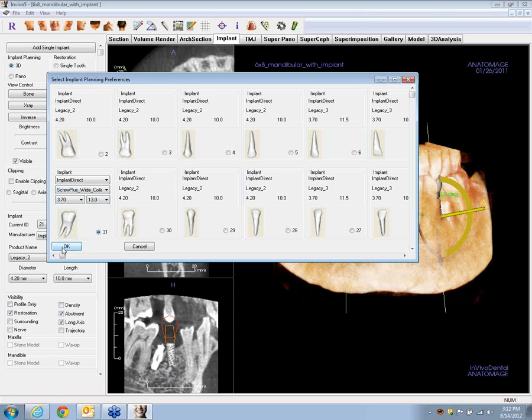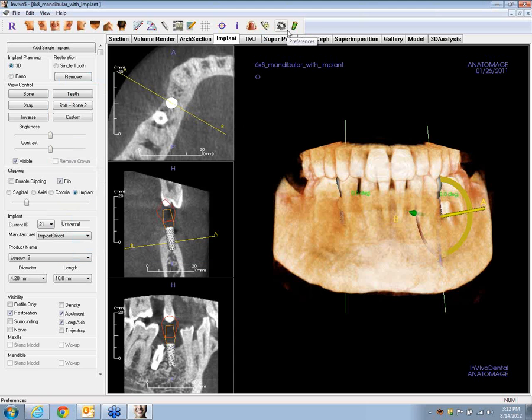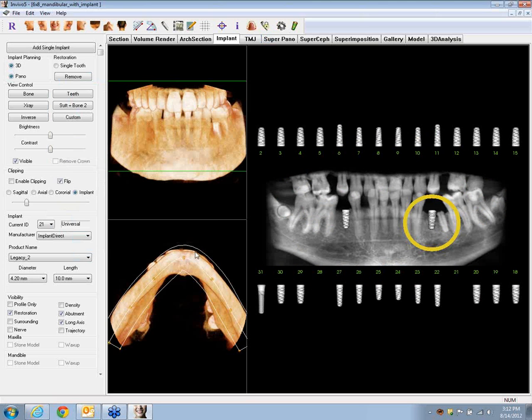You can see the changes as I say okay. Those changes are recorded so that when I take a look at my add implant library, the change to that inventory has changed like this. You can see that new implant is in place there.